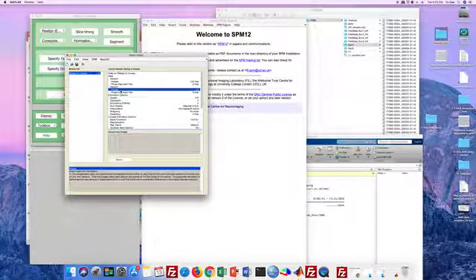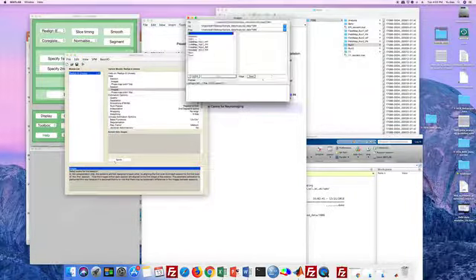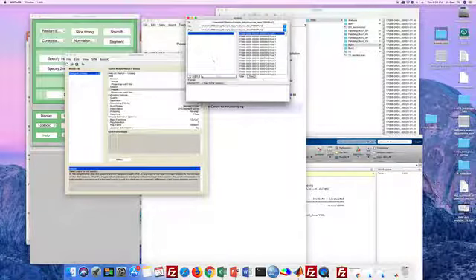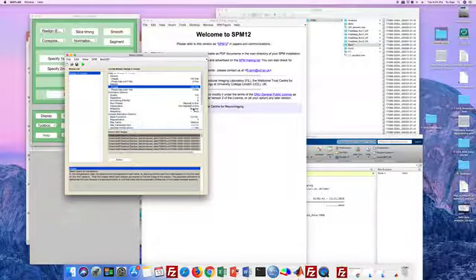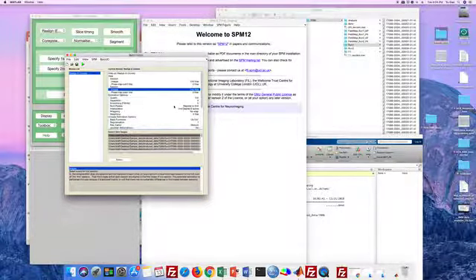And then go to the next section, specify, go to the ROM 2 folder, select all, and done. So you're done with our setup. Keep other options as the default setting.